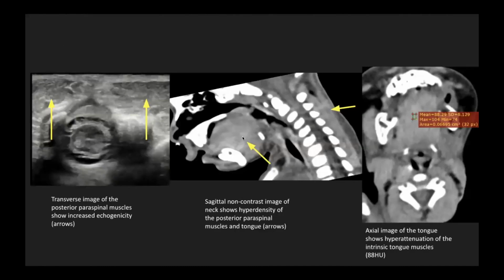And so if it's echogenic, the natural consideration is that there is probably fatty infiltration. However, when an NCCT was acquired, we could see that there was no fatty infiltration. Instead, attenuation was higher. So what can cause echogenicity and higher attenuation? It is definitely not fat.